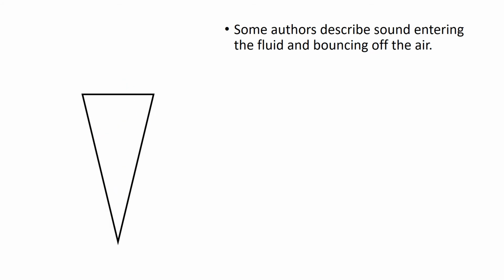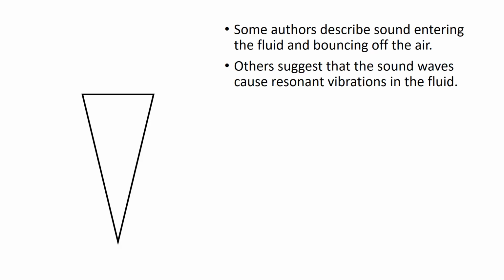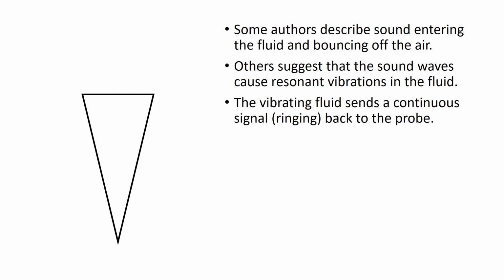Now, other authors think that this doesn't really have anything to do with reverberation and that it's more of a resonant phenomenon. Some people suggest that the sound waves hit a particular frequency, which causes a resonant vibration in the fluid. The theory here being that the sound wave enters and the fluid just sort of shakes and vibrates. That vibrating fluid sends out a continuous signal, almost like a ringing, back to the probe, and that's what you're seeing as this continuous line that never ends.